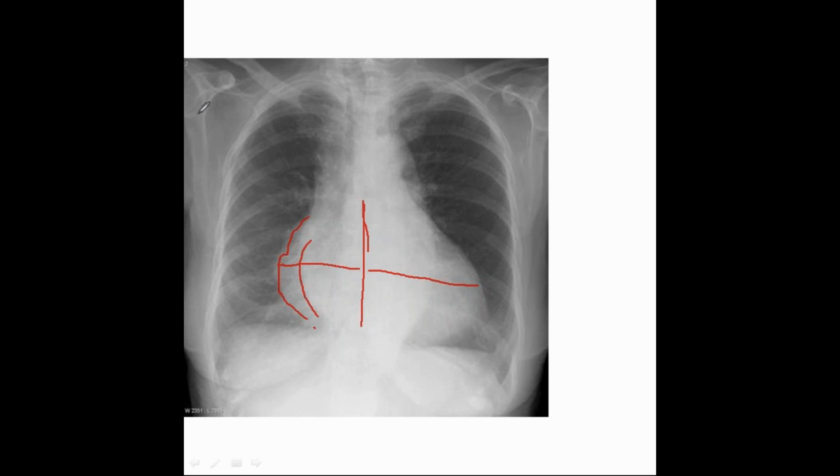Now, see, in this X-ray, you can say the mediastinum is widened, but aortic dissection is not the right diagnosis here. The mediastinum is widened, it could be a possibility, but the exposure is not good, so you're not able to follow the aorta completely. It should be going like this. This is how the aorta goes.